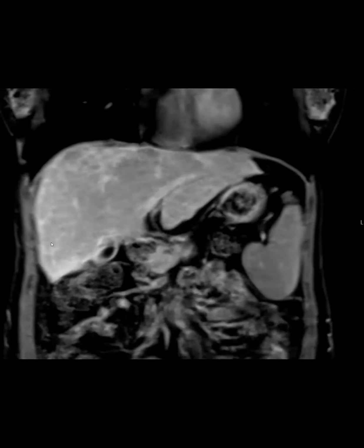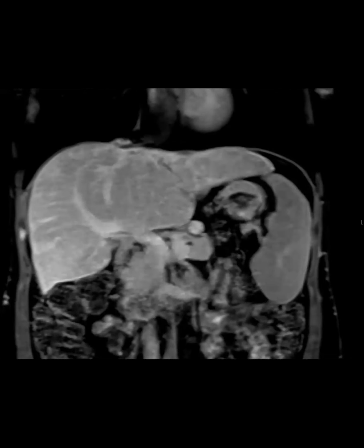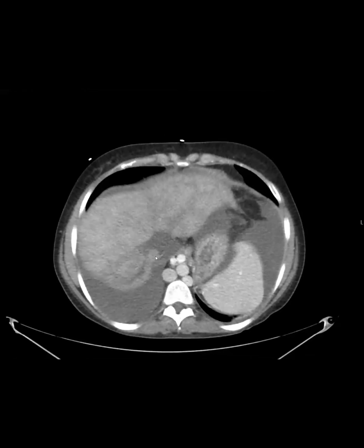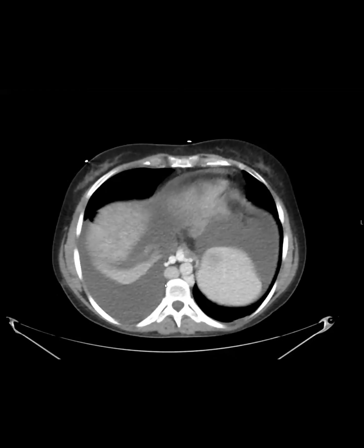It's interesting. That's a good question. But basically they just came back to us afterwards and were like, did you guys see this? Did you know this? Okay. So now I just want to show you post-transplant. This is now post-transplant, and you can see that there's this little conduit here.